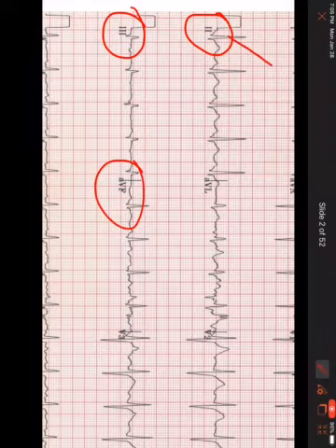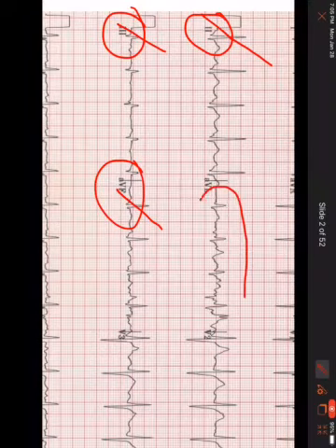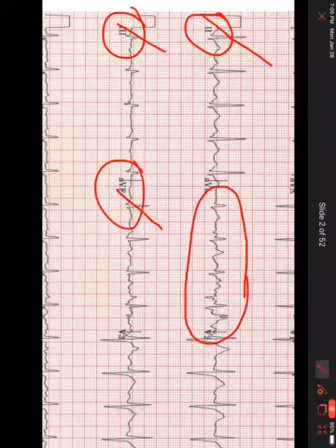So let's go ahead and cross out the first beat in each lead there, okay? So I'm not going to look at those for my interpretation. Now, if I have a really bad 12 lead, and let's say, for example, right here in AVL, I have some pretty crappy waves to look at, right? I don't really have a ton of good options there to look at. Well, then maybe the first beat is my best option. I don't know. And we'll get to that when we get to our lateral leads. But typically, I never use the first beat unless, like it is in this example in AVL, it seems to be my best option. So let's go back here to leads 2, 3, and AVF.